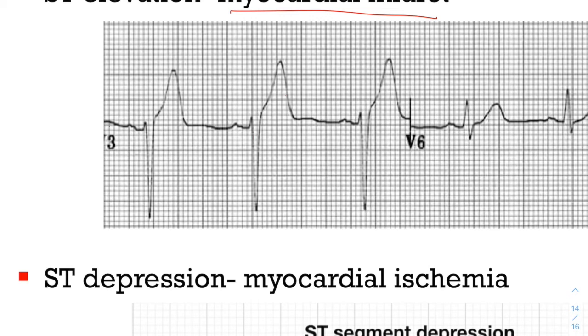So that's a full transmural thickness infarct of the myocardium. And here you can see this is kind of your isoelectric line going across the ECG for the most part. This is your Q, R, this is your S wave, and as it's coming back up, you expect it to hit the isoelectric point, but it actually goes above, and this is actually where the J point sits. And then you have this high peaked T wave, and so this is pretty classic ST elevation.